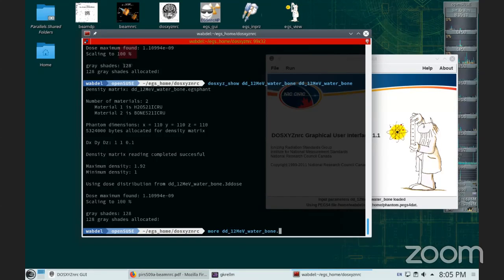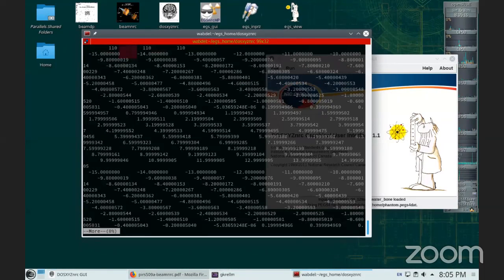So basically, does the stat dose come with the MinGW interface, or is it only for Linux? No, it's already installed. You should try it on Windows. So you try it with the CMD. The dose XYZ should also work, and you don't need to compile them. They should be compiled and ready. If you have Windows, just in the terminal, type stat dose.